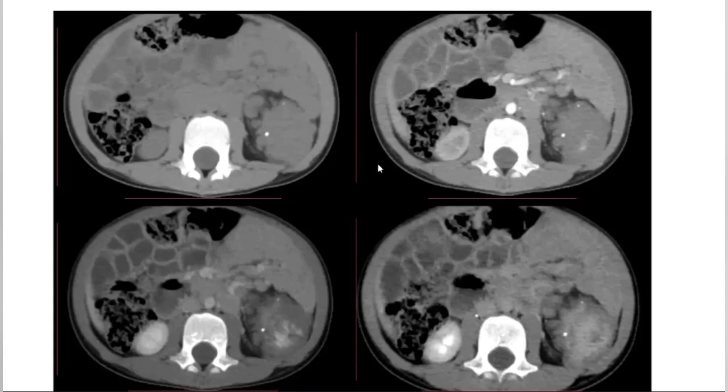So I'll just add on a couple of things which might help you. I know these are not the complete films. These are just the representative images that we have collected. So you of course have to correlate with the history of the patient. This patient presented with constipation and rectal bleeding. So this is not exactly the kidney that we are looking at. But that's another issue. You can always scroll through the films.